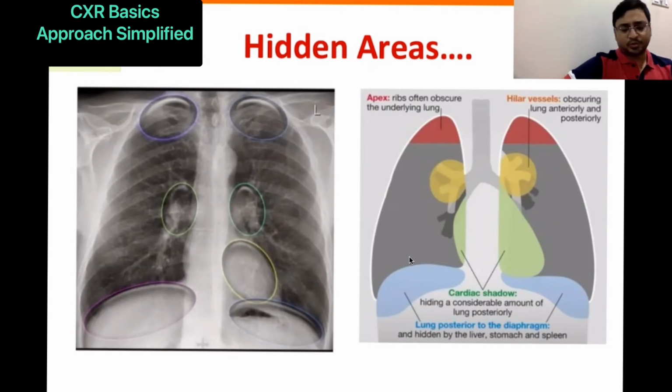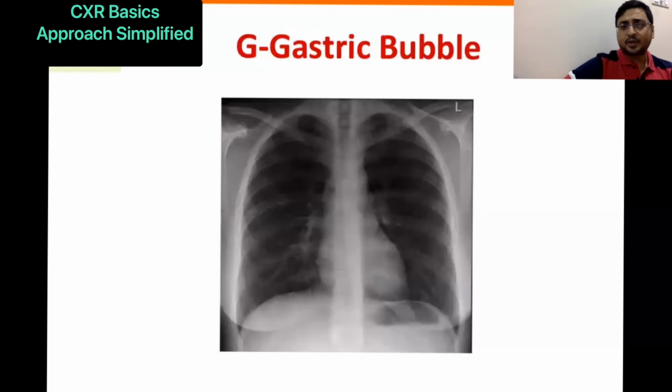This is an extensive topic, the approach to chest X-ray and the different cardiovascular as well as respiratory pathology, that you have to learn over a long period of time by seeing chest X-rays and at the same time reading the textbook. However, these are the basics of the approach to different views of chest X-ray, as well as the different aspects of chest X-ray that we can describe. So this is how it looks.